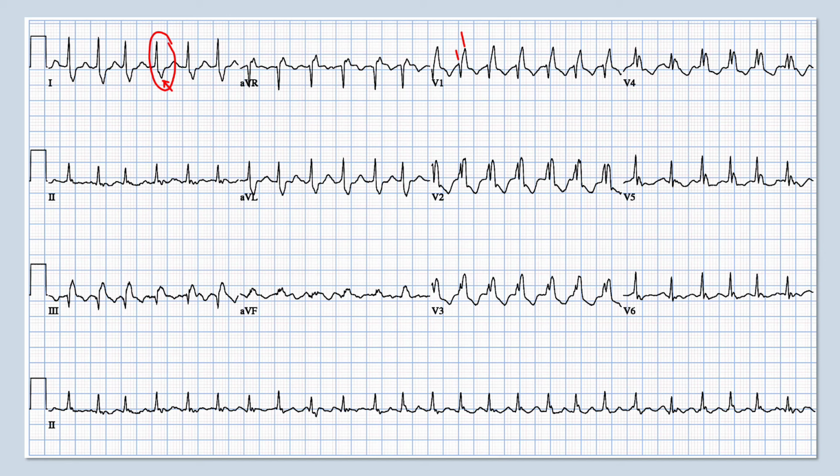So I would say, generally we would start any ECG with saying this is probably 80% VT, but seeing these features would definitely make me question the VT diagnosis. QRS morphology is never absolute. I can't say with 100% certainty this is SVT because QRS morphology is probabilistic. However, it makes me somewhat question whether it is VT or not when we're managing this patient. But certainly I would manage them, especially if they're unstable, as a VT.